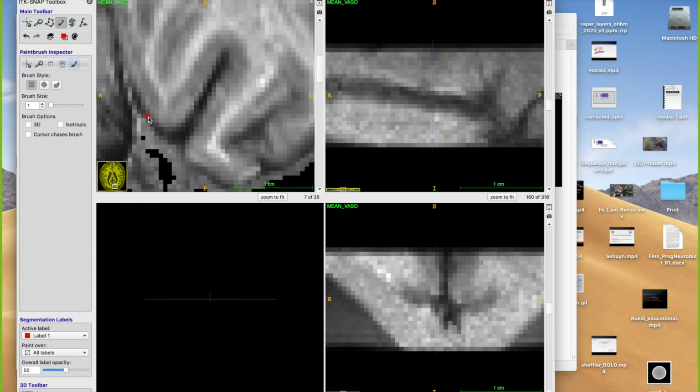Farouk wrote a program, so-called LN_RIMIFY, which will permutate those and generate them in the way that they can be used in LAYNII. So now I'm just doing the same thing, just filling it up. I'm lazy, so I'm just filling one side here with the value of 1. Then I have the value of 2 to draw the same thing on the white matter borderline. And then I'm doing the rest with 3s.